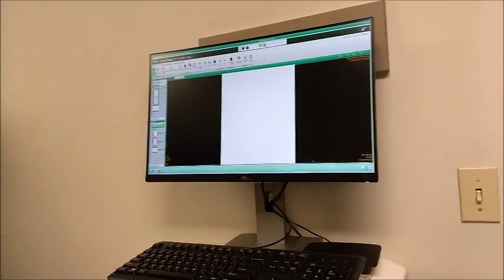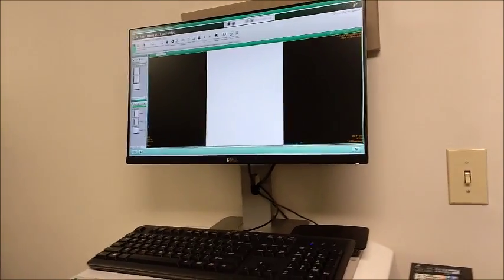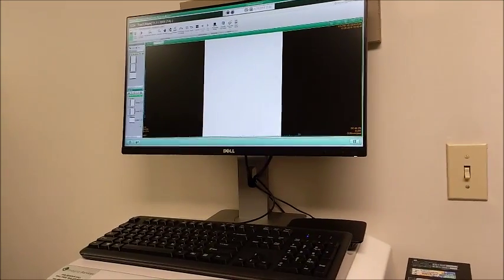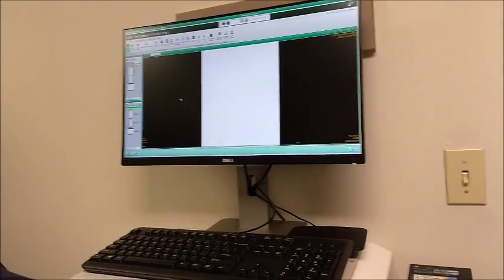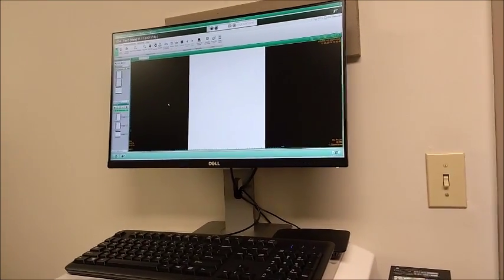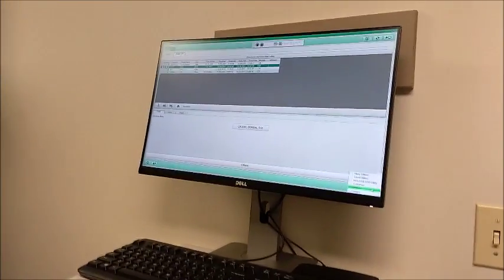Well, I can show you how to delete. Maybe you don't want me to. No. I don't know why we'd ever want to. Okay, then I won't even show you the study utility at all. No hospital I've ever worked at has allowed people to delete. I don't think we'd ever want to delete, because you can accidentally completely screw something up. I can't think of anything else you'd want to do in the study utilities.